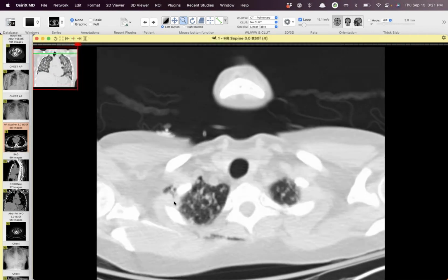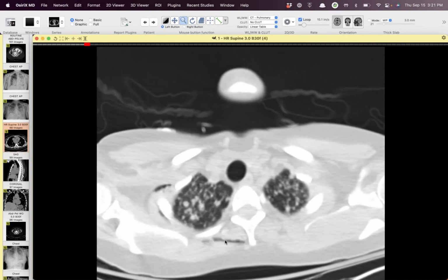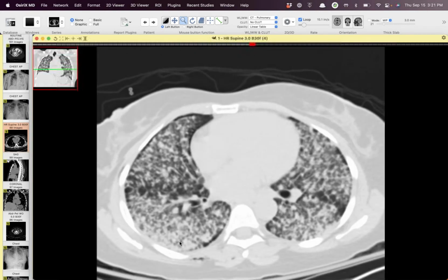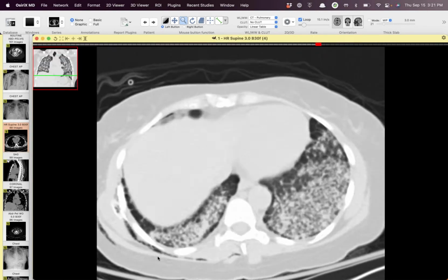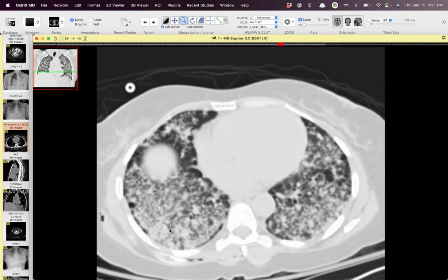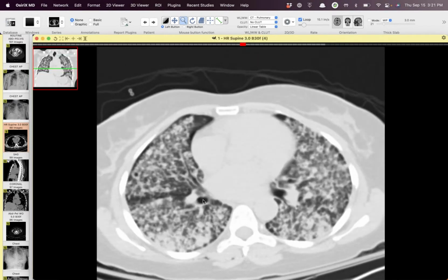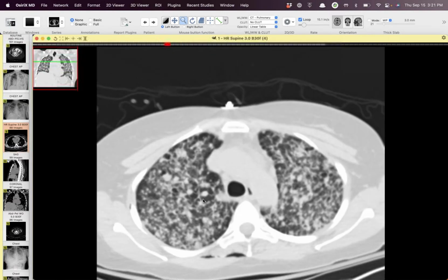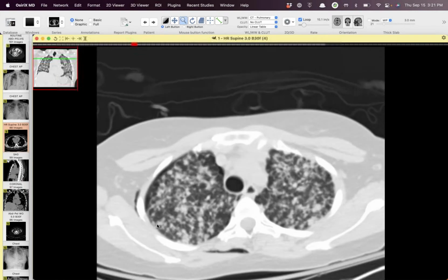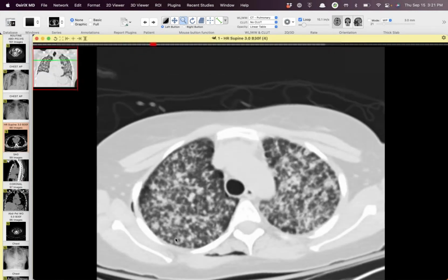She had several CTs. You'll note there's some subcutaneous gas here, and I don't know exactly when this was taken, but it's because the chest tube ended up outside of the lung and outside of the pleural space in the back. This is a thicker slice, but just crazy, the number of nodules diffusely involving her lungs.